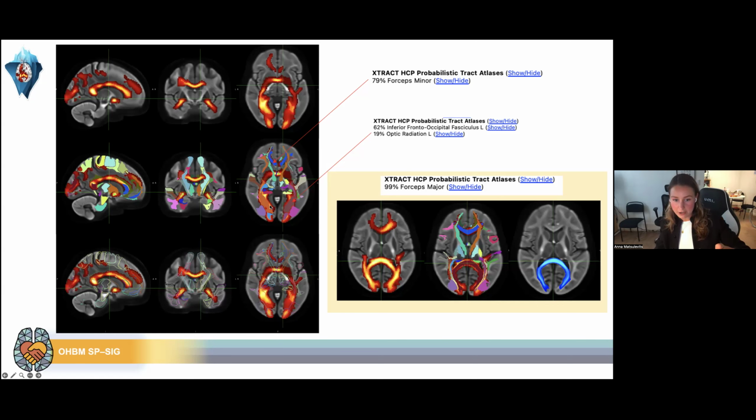And then you can just move around here and check the fiber that might be disconnected. You can also load it without coloring the tract, so you can more freely check your DeepDisco output.